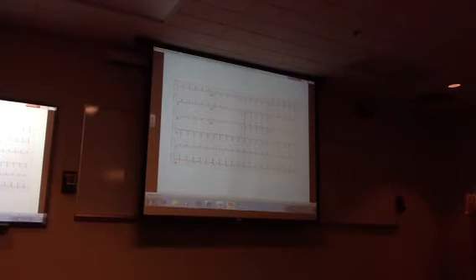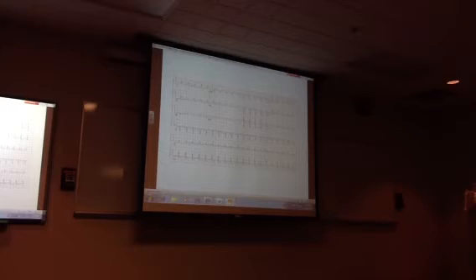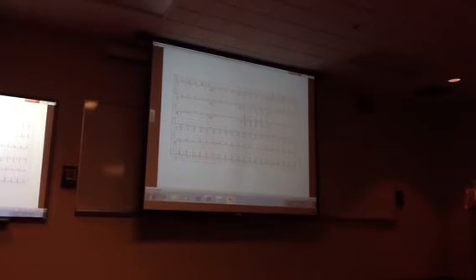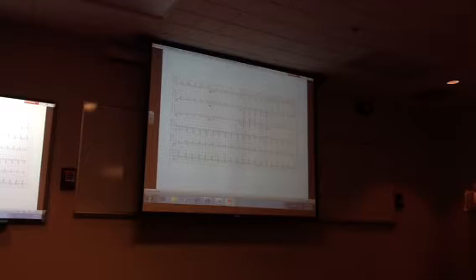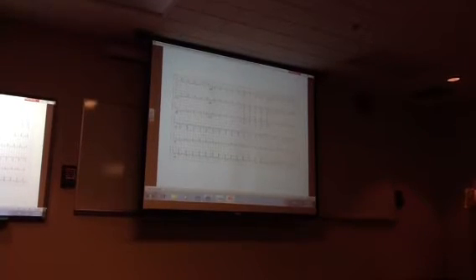So I hear RR intervals. If you took this fellow's pulse, you're feeling the RR interval, right? You're actually getting the rate of the RR interval. Every time you see a QRS, there's going to be a pulse, hopefully, unless there's a blood clot in his radial artery. So we look at the RR interval, and we see the rhythm strip below, and it looks like the rate is about what? 150, slightly 150 or so. So he's tachycardic, right? All of a sudden you're getting concerned, and Justin's right to keep him from going to the OR.